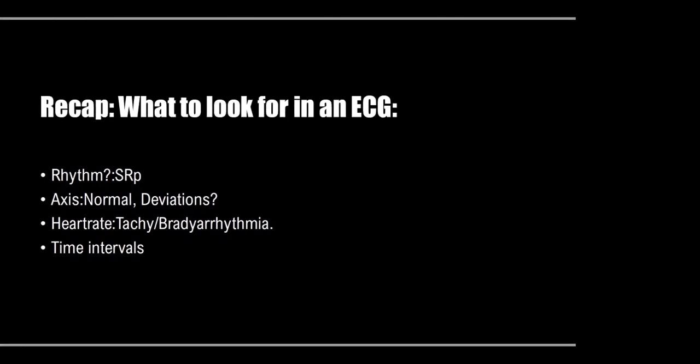The most important thing, and what we are going to concentrate on in this presentation, are the time intervals. You have the P waves and you have the QRS complex. The time interval is very important, because today we are going to talk about the AV blocks, and also the right and the left bundle blocks. For these, it's always important to have your time intervals with you. Next slide.